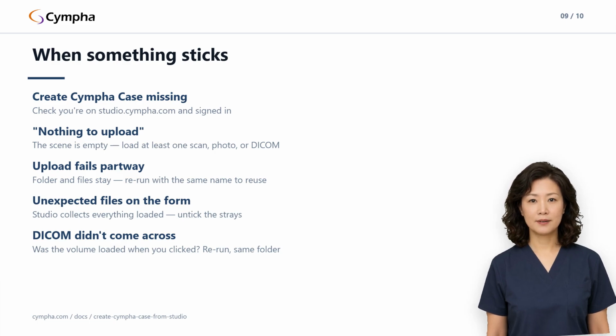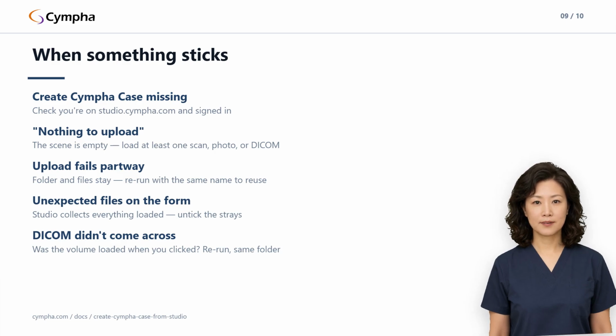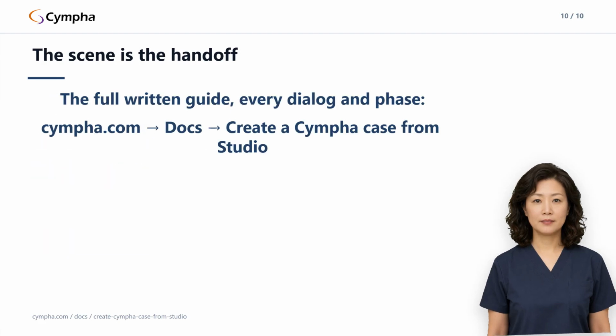And the DICOM didn't come across. Confirm the volume was actually loaded in the scene when you clicked, and watch the upload progress for an error. If it failed partway, rerun with the same folder name, and it completes.